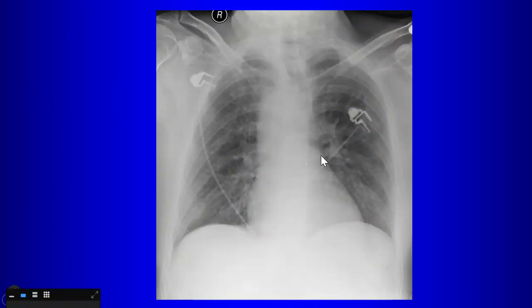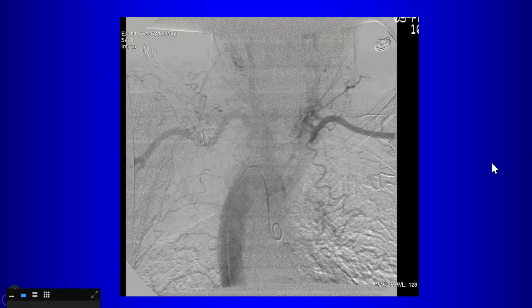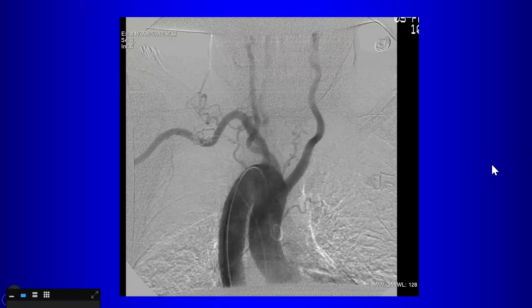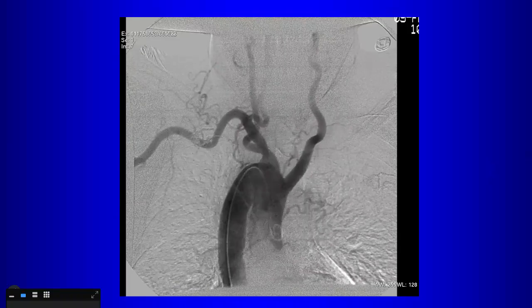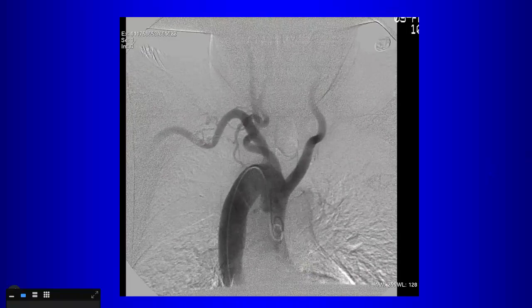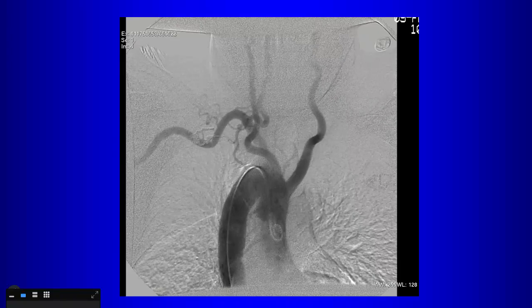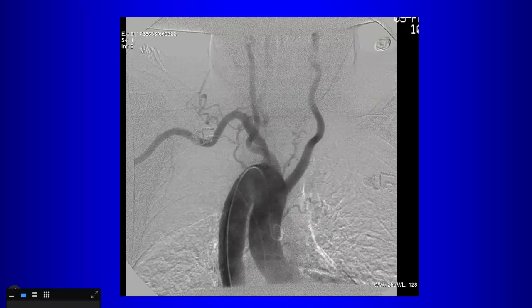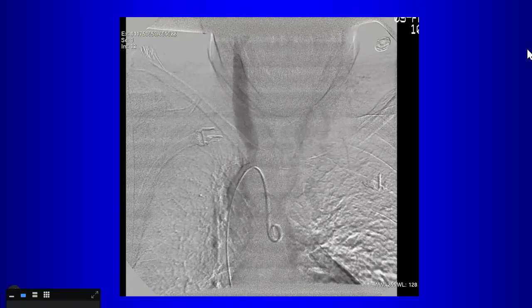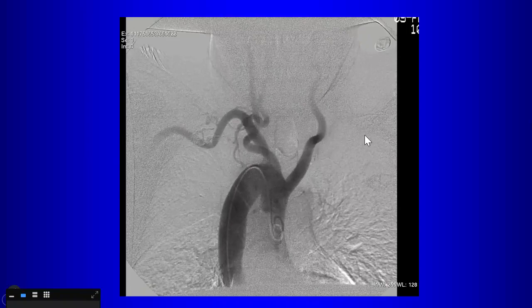So, chest radiograph, another patient with right paratracheal opacity, so in this case, again, a right aortic arch, right? But the angiogram is kind of peculiar. What's peculiar about the angiogram? There's not really a left subclavian, it will show up late. Yeah, the left subclavian shows up late, right? So why is it showing up late and how is it filling? Retrograde flow, from the cerebral circuit? So what's coming down retrograde to fill the left subclavian? Yeah, the left vertebral artery. So you'll see the left vertebral artery will be coming down and filling it.